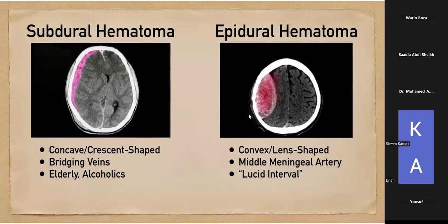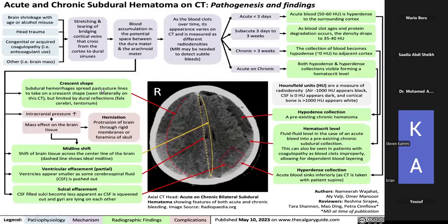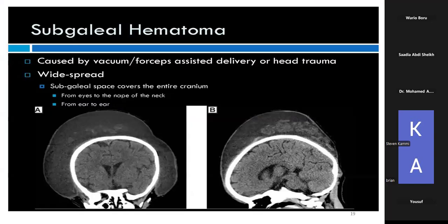How to differentiate MRI from CT. So look at this. You can see the outline of the skull. S-K-U-L-L. So the skull is well outlined compared to an MRI. Look at an MR. You can see in all of them how it is here. I think I had one MRI.